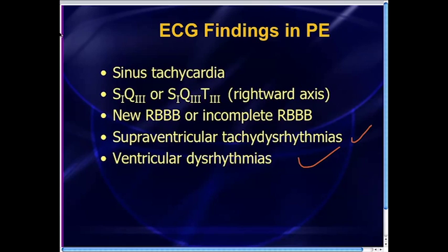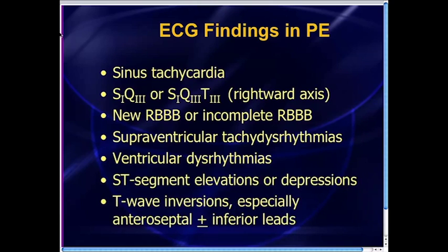Here are a couple things that for people that haven't been keeping up with the EKG literature or the EKG videocast, you may not know about this, that PEs can produce ST elevation or ST depression, not necessarily that commonly, but it can mimic a STEMI or a non-STEMI. And the other way that PE can mimic non-STEMI is with T-wave inversions in the inferior and anteroseptal leads.